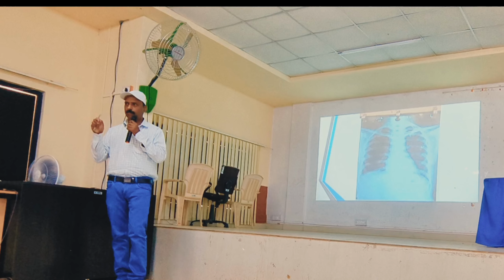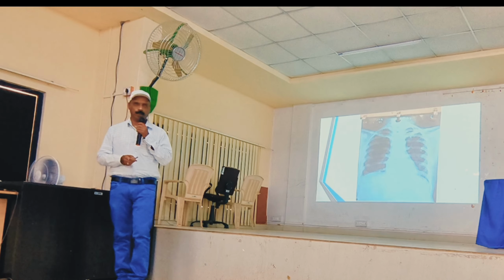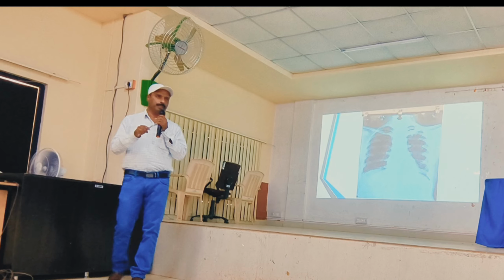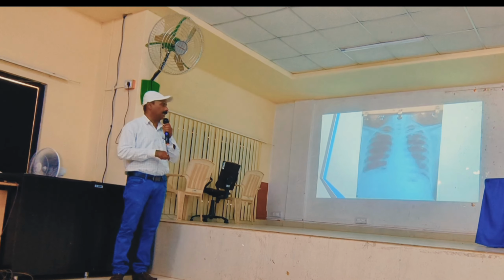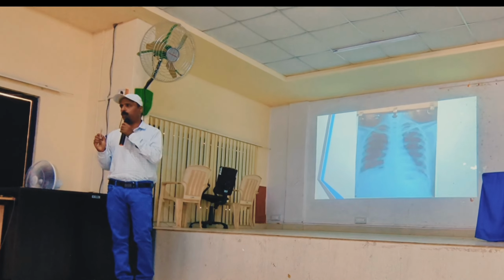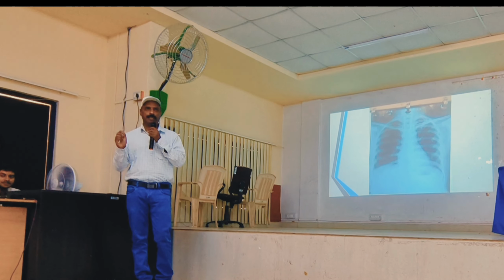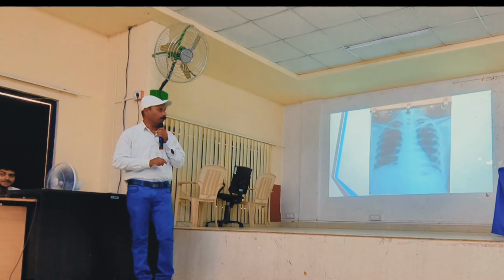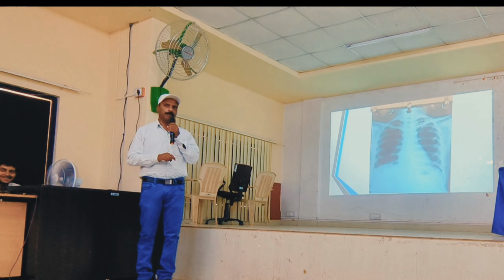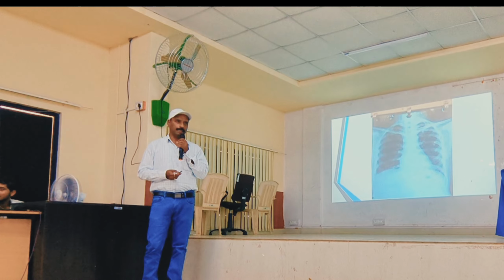Then bones, including clavicle and ribs, you have to highlight, and vertebral column. So this is the one which is including the domes of the diaphragm. So this is the one which you have to comment on the PA chest. So this is the basic of the PA chest we have completed here with the common specimen in the total spottings and in the exams.